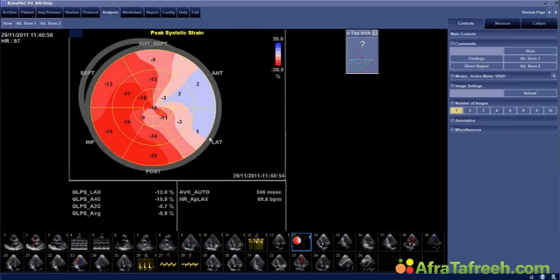So in conclusion, what can we say from this case? Well, first of all, the patient has coronary artery disease, and the patient needs obviously some treatment in this direction, and the abdominal pain is probably something that has to do with ischemia and not with some form of gastritis or whatever. So that was the first information we got from the echo.